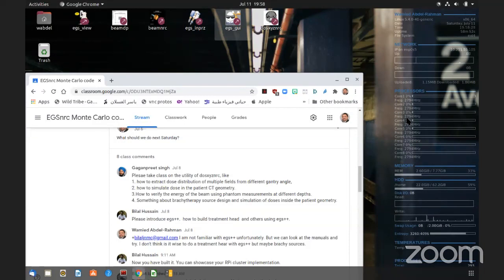Okay, that is done. Any other questions related to this? For your cobalt machine, look at where 80 is, at your isocenter. That's probably not a good place, especially if you're doing this for patients.